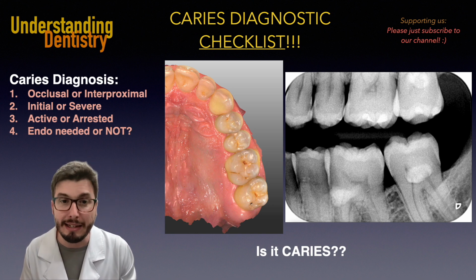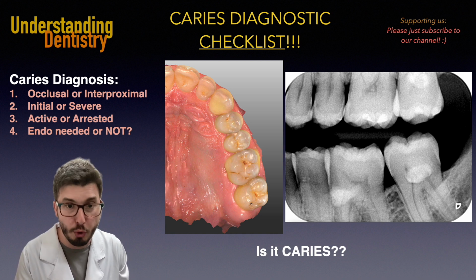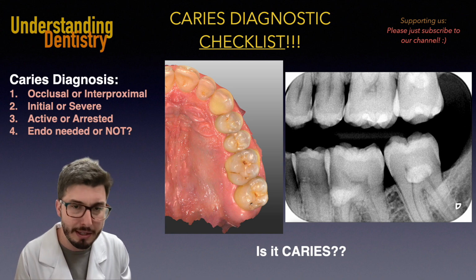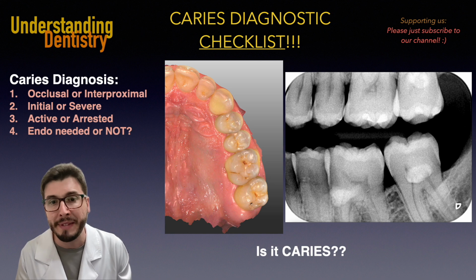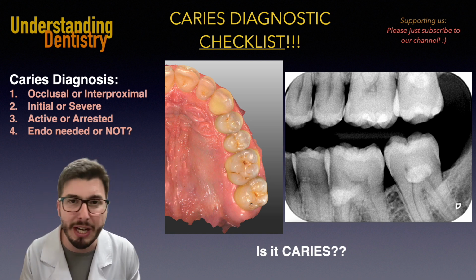You guys are seeing interproximal caries between the premolars. Okay, let's focus on the upper arch now. So between the premolars, we have interproximal caries. There is even a shadow of the first molar, but this is not conclusive yet. I will explain why very soon. And then we have these restorations. We have staining of these restorations.